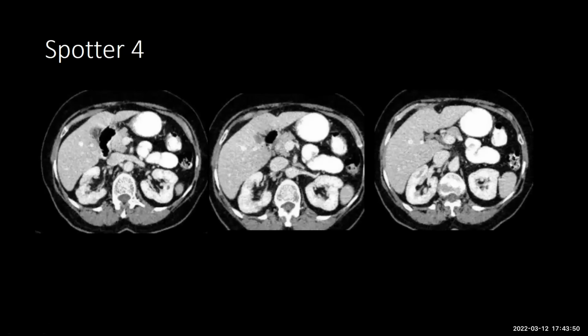Okay, let's go to one more variation. A little tough; I'll give one. It's a variation. Just look for any variation in anatomy that you can see. The clue is that it is very rare. The pancreas. So what is it? Not annular pancreas, some anomaly of the pancreas. I agree with you. I think Vanessa is speaking up. What is that?